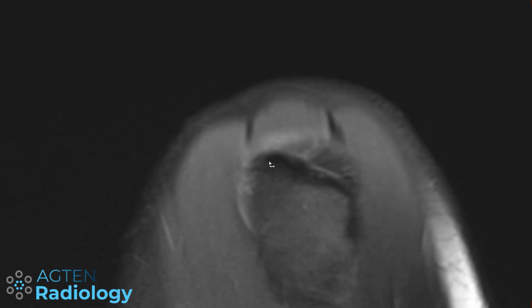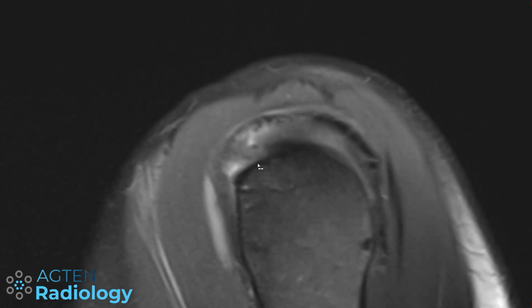And on our sagittal view here, on these 3mm slices, it's really hard to say whether there is some bursal layer still intact or not. So what did we learn this week? Basically two things. If you see a cyst in the rotator cuff muscles, go check the tendons, because there is a high probability that there is a rotator cuff tear. Sometimes they are not so obvious. It can be full thickness tears, but it can also be partial thickness tears in an equal distribution.